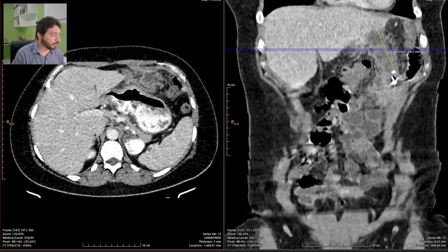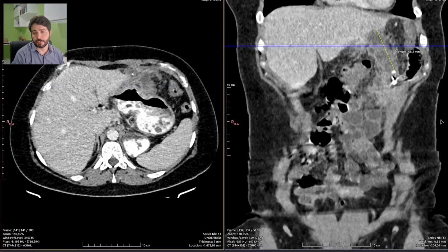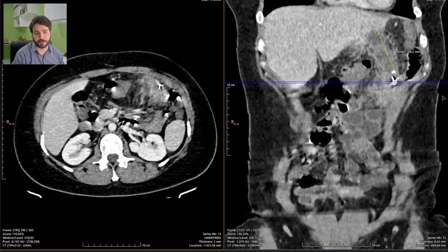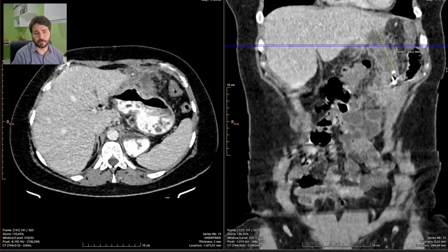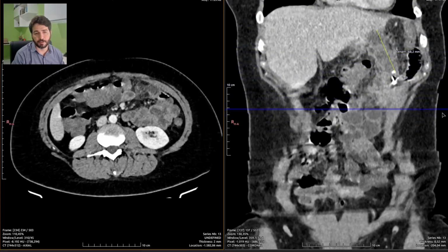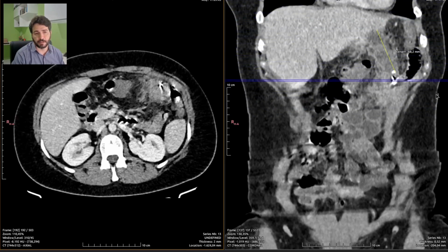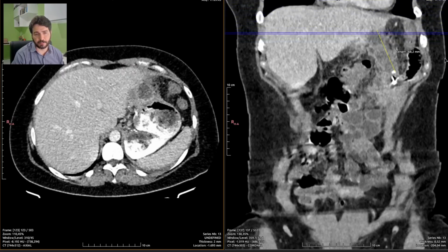And I left a footnote saying that this tiny amount of oral contrast that was given to the patient to drink didn't get out of the stomach, the gastric chamber, but it's really not the case.